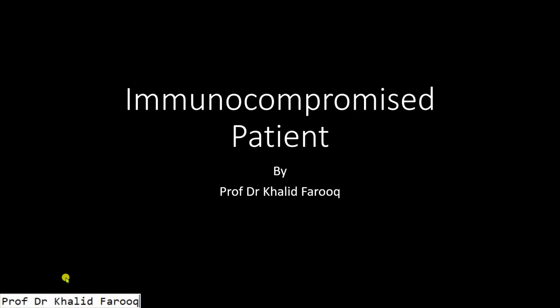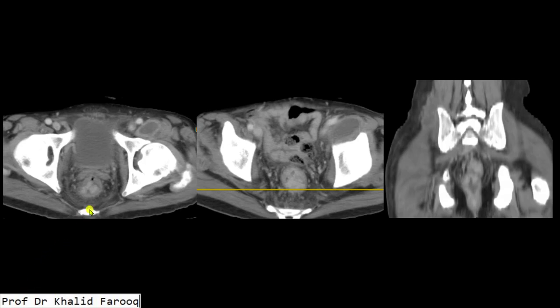We are discussing imaging of an immunocompromised patient. Basically, this patient had carcinoma of the anorectal region. We can see abnormal growth is appreciated in the anorectal area with perirectal nodularity and infiltration, suggesting extension of the disease to its surroundings.